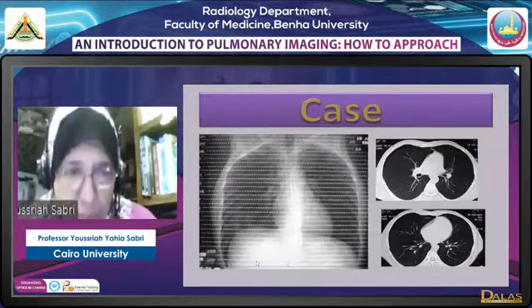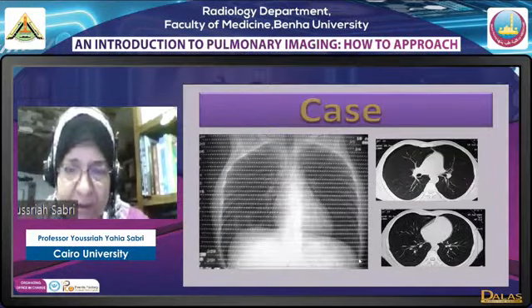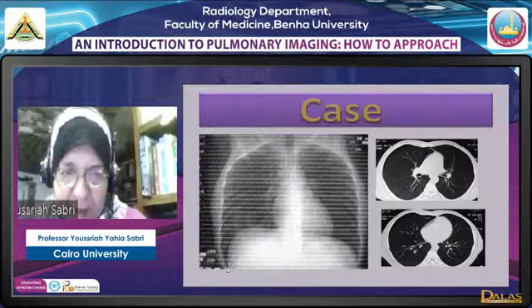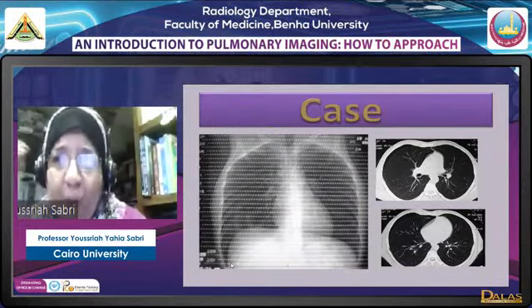Now here, what do we have? This is a scanogram in a case of pneumothorax. Look here, this is a normal costophrenic angle, while this is a deep costophrenic angle, a sign that we call the deep sulcus sign. This is how we see pneumothorax in a supine patient.